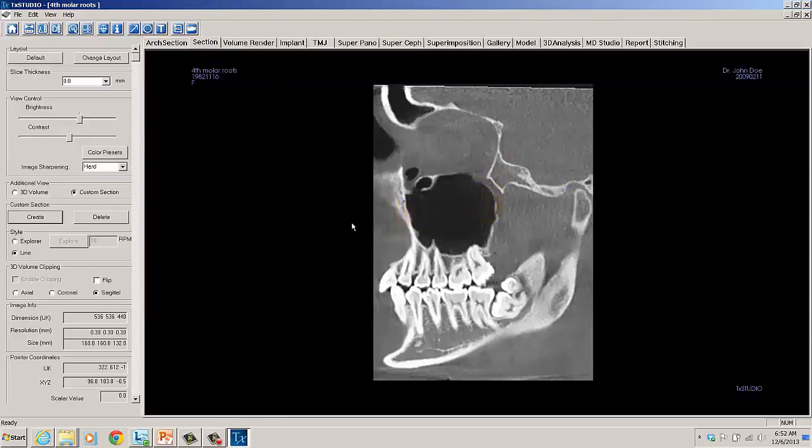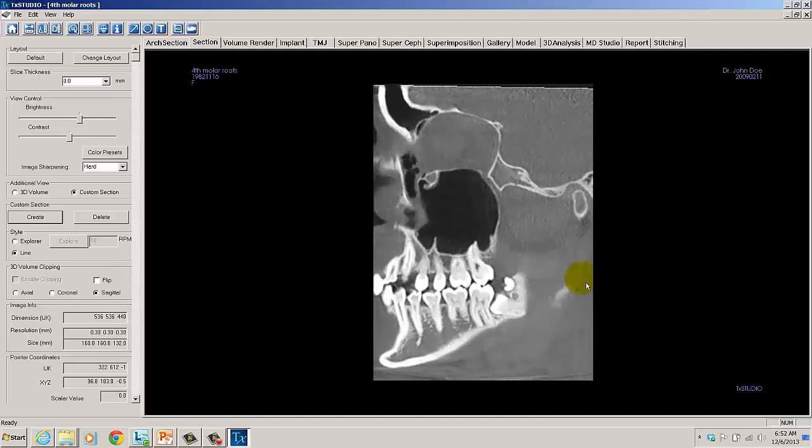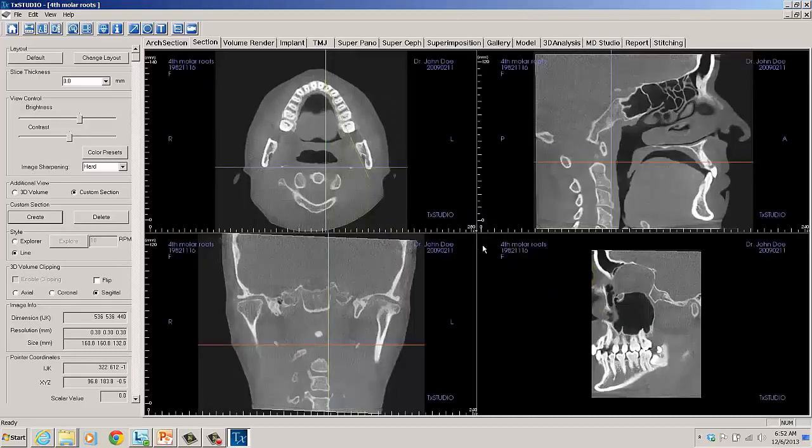Now, we do not have our oblique line any longer that we can utilize to move through the slices, but we can place our mouse pointer on the window, or it should be already there, and then take our scroll wheel and move it forward and back as we go through those slices. And we're simply making a thin cut through the anatomy, a thin slice, and looking at a perpendicular slice of that line.